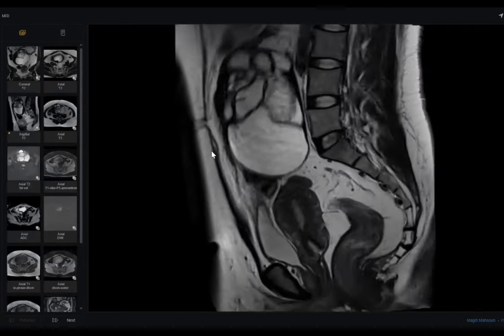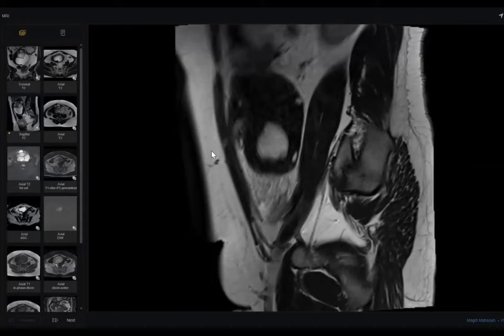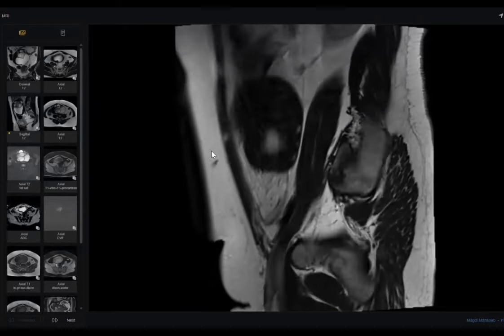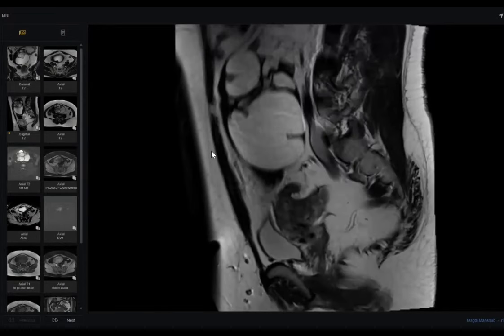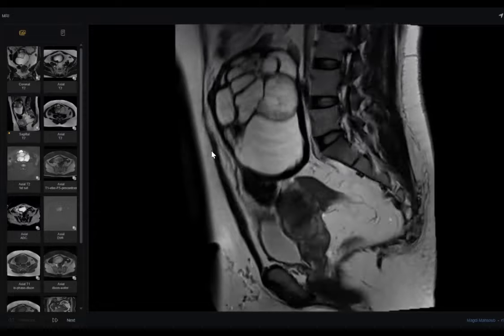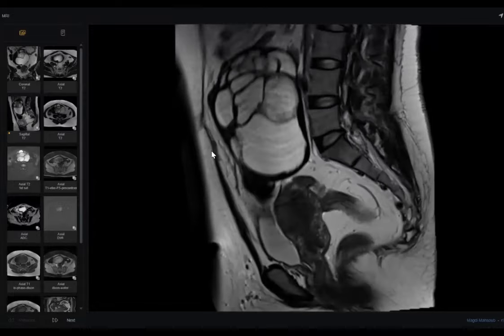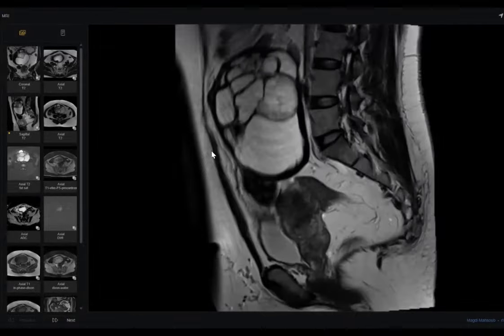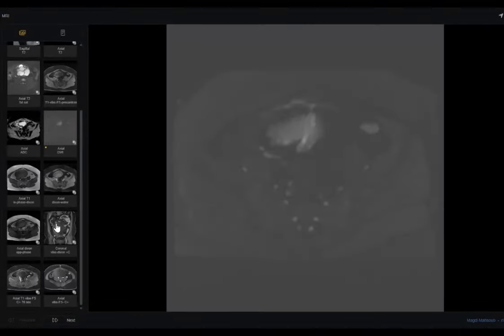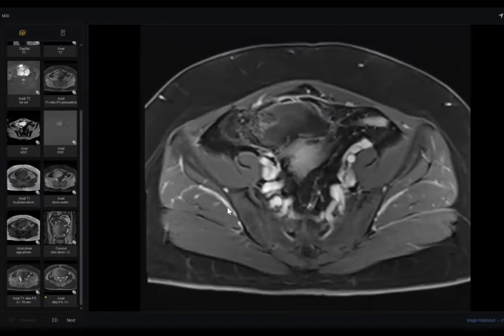So what's your final diagnosis, doctor? So this is likely a neoplastic etiology of right ovarian origin. Considering the solid enhancing component, I'm suspecting mucinous cystadenocarcinoma, with no significant ascites, peritoneal spread, omental caking, or any nodal spread. I will immediately inform the referring physician. Sure? Are you sure this is mucinous adenocarcinoma?